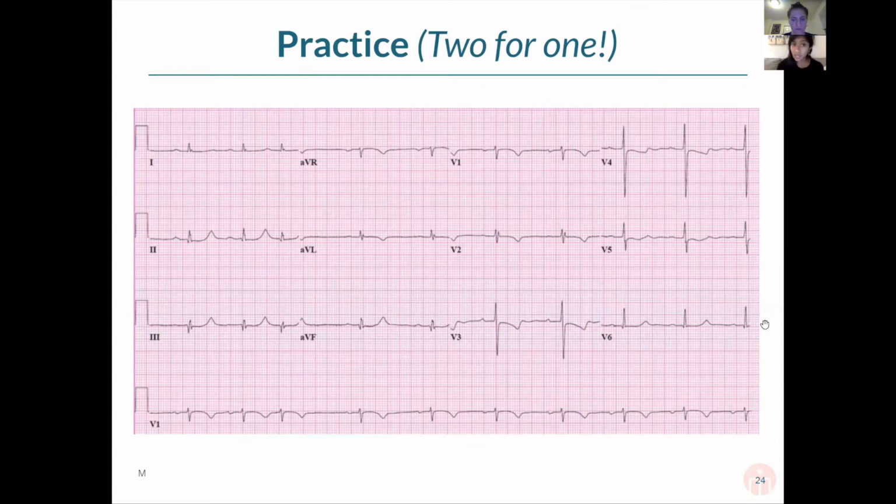The reason this is not Mobitz 1 is because with Mobitz 1, again, you would see lengthening, lengthening, lengthening, and then a random drop. Those have a gradual lengthening, versus here, we're seeing pretty consistent intervals in front of all of them. Mobitz 2 would be like the random drops. But again, we're seeing pretty consistent PR intervals in front of all of these complexes. So the diagnosis here: sinus bradycardia and first degree AV block, as a lot of you have accurately said.